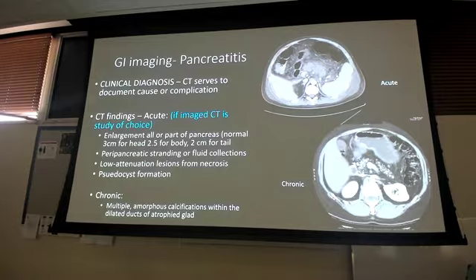If I give you a hypertensive cardiovascular disease patient in the vignette, and I'm asking you to tell me what the disease process is or what the condition is, and it has an enlarged aorta, I can't put aortic aneurysm and hypertensive cardiovascular disease as both answer choices, because technically they would both be correct if there's an aortic aneurysm on the imaging. That's kind of what I was getting at. That's why I say read the question first, because you're probably going to have more than one abnormality on some of these chest X-rays. It's so hard to find just a singular one because some of these patients are sick, right? So understand what I'm looking for from a time management standpoint. Did that answer the question?